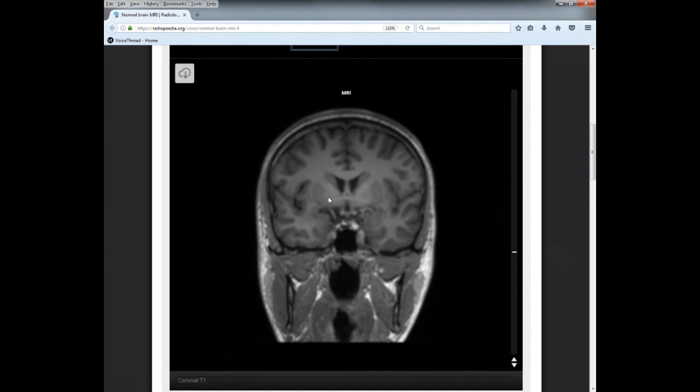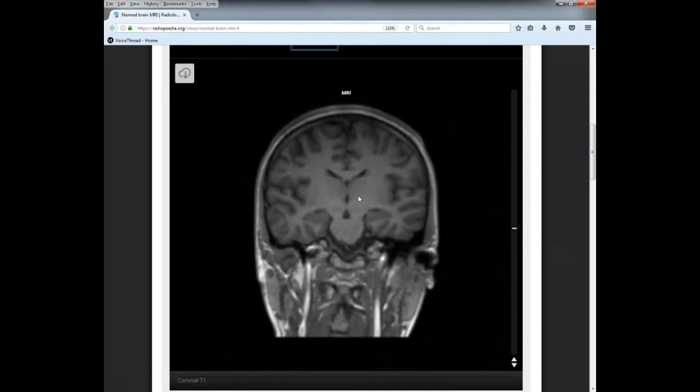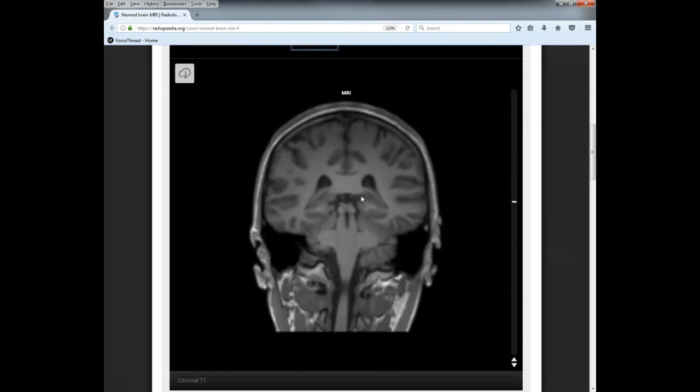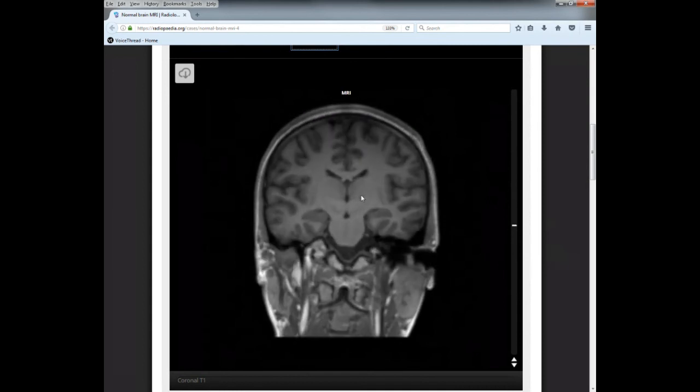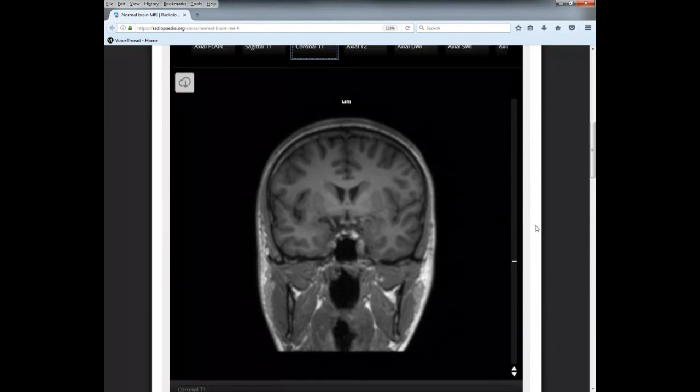Anterior commissure. That's your right and left hemisphere communication. Okay, one of the only spots. All the way back, it's harder to see. You can't see the posterior. You can see anterior right there. Okay, the anterior commissure communicates between the right and left hemispheres, and it's located right inferior to the corpus callosum.